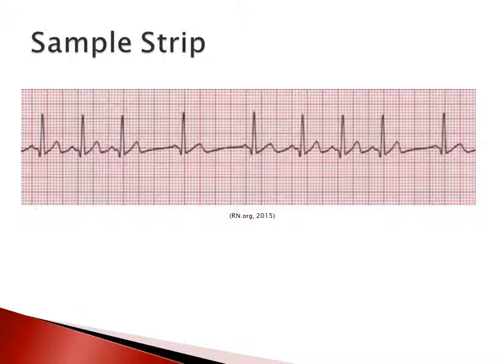And we can see that there are T waves present across the whole strip, and there are no peaks or inversions. And finally, our QT interval appears to be 9 small boxes long, so that's 0.36 seconds, and we know that this is a normal measurement. So all of the characteristics are normal for this rhythm strip except for the rhythm, which is irregular. So we know that this is from a patient who is in sinus arrhythmia.